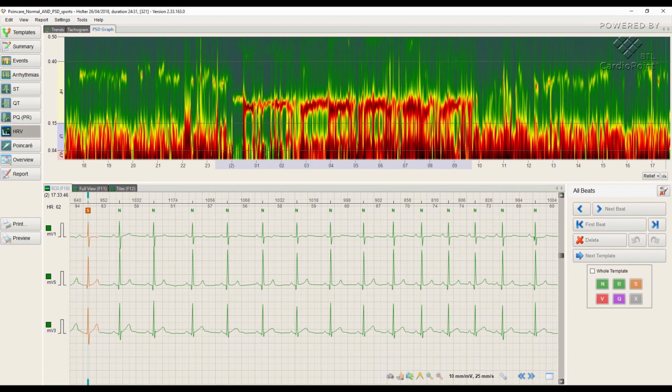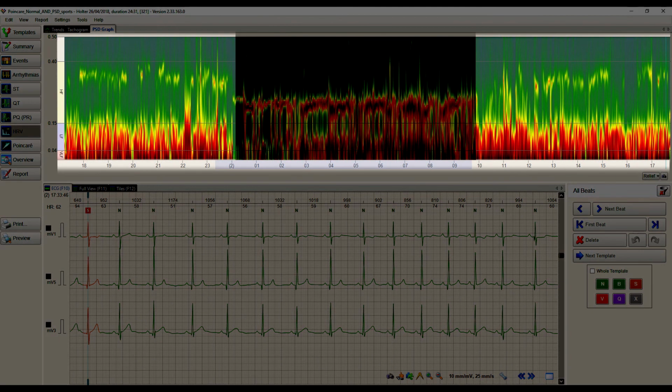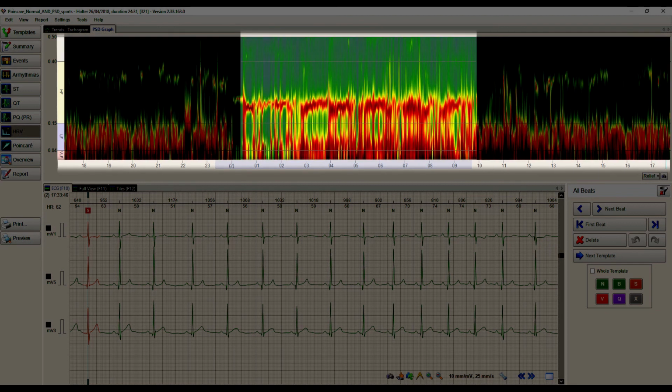And in a final example, we have an athlete's PSD. Overall spectrum power is high with average relative dominance of high-frequency waves and higher parasympathetic activity. The patient shows good quality regeneration potential while sleeping.